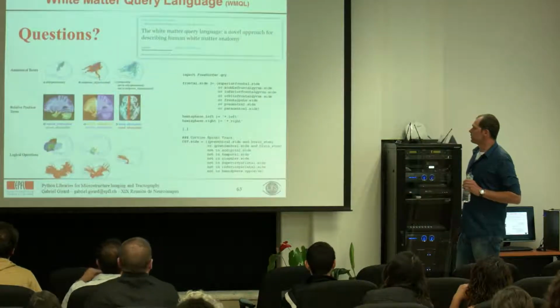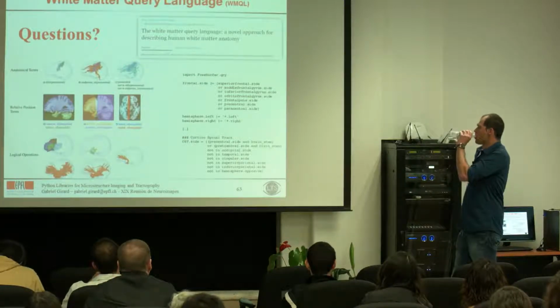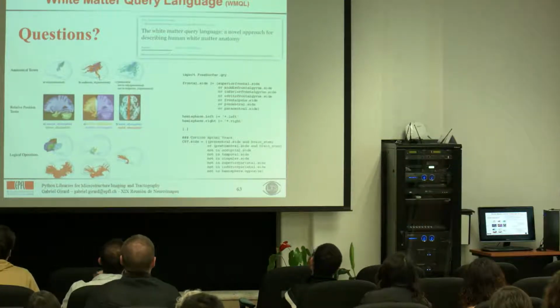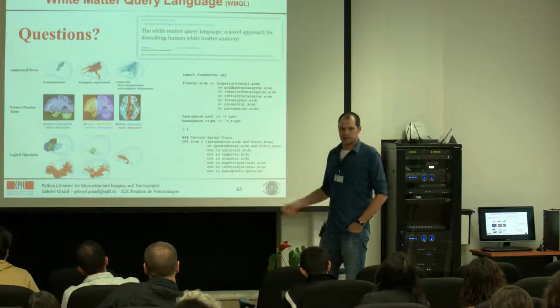So again, it's very simple to get the tool working on your platform. Everything is in Python behind, but we have some scripts, in this case, to help you run the queries from your atlas, streamlines, and data.